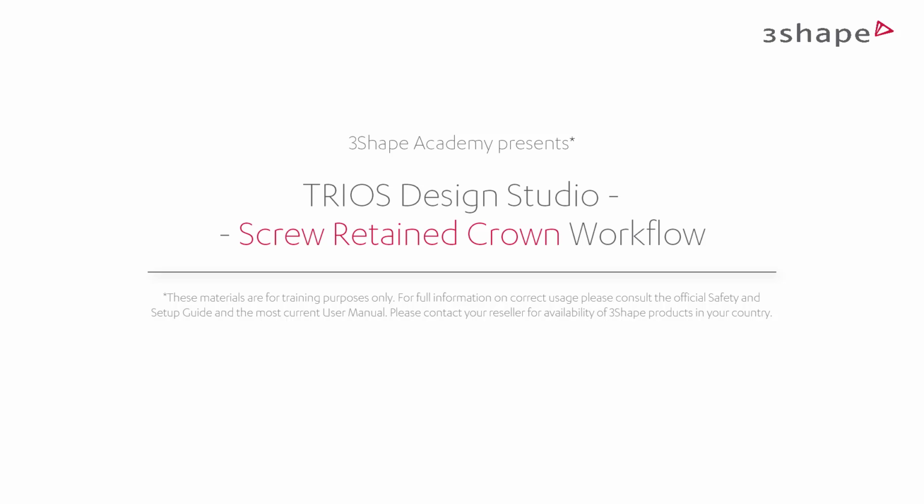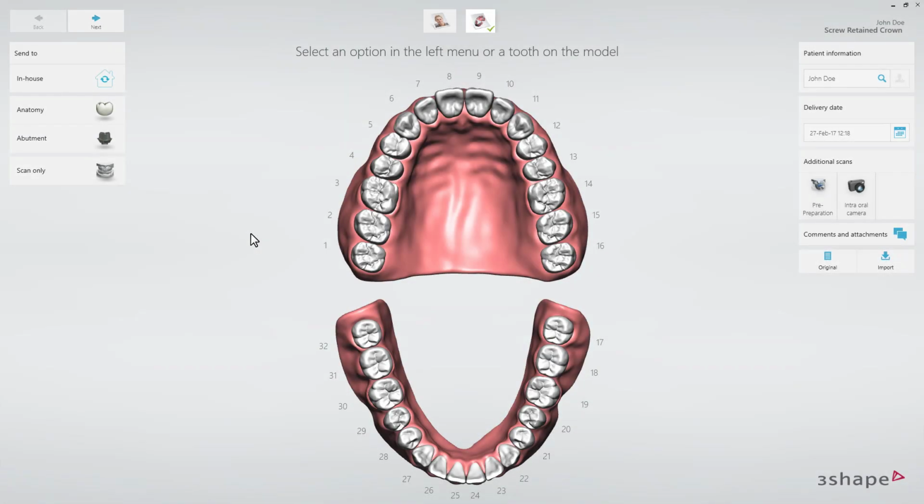In this video, you'll learn how to design and output the STL file of a screw-retained crown restoration for a patient that already has an implant. All of this is done in-house. Screw-retained crowns will be offered as an integrated workflow in TRIOS Design Studio. It will allow dentists to offer immediate production of screw-retained crowns on the same day, with a significant time saving and a reduction in production costs.